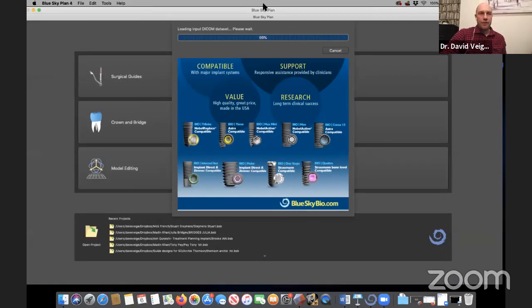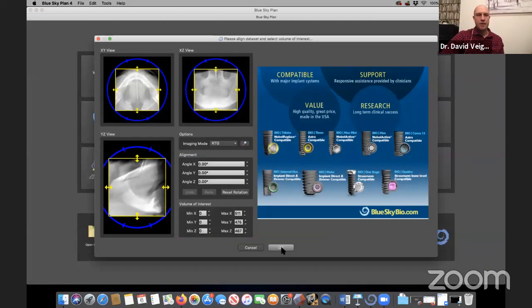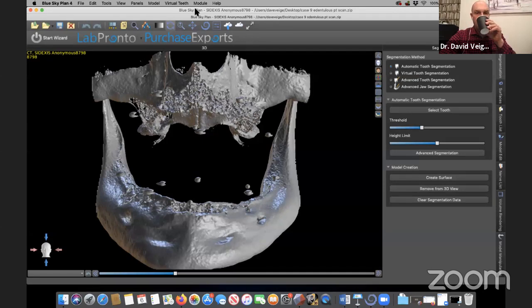And it'll load that file in for you. There it is. So we'll go through this case together. If anyone's watching this, you can record it. It's no problem at all, so you can look back at it.